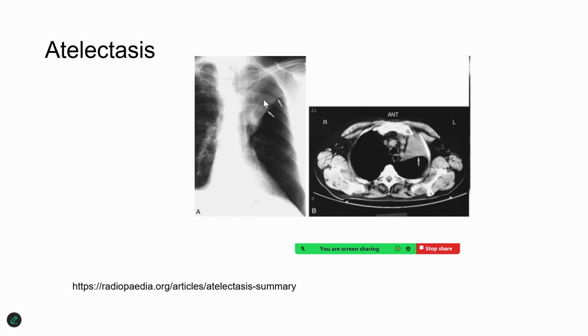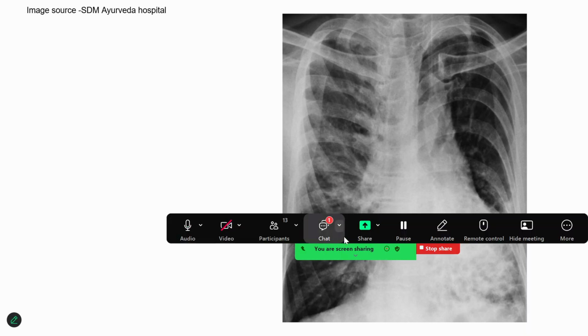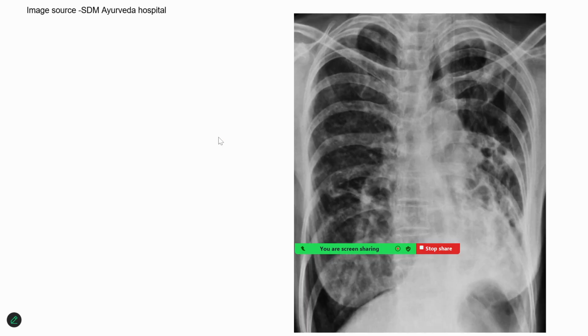The displacement of the area, collapse of a lung lobe also could be a consequence of the same, which can result in a restrictive pathology. These also become restrictive as such, or a gross fibrosis and multiple emphysema areas, fibrosis in some areas, the atelectasis in some areas, the left lower lobe atelectasis. So multiple issues could occur in a patient with chronic bronchitis, and clinical severity also would vary.